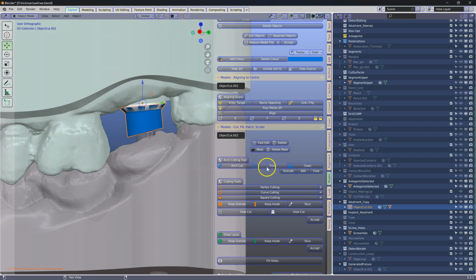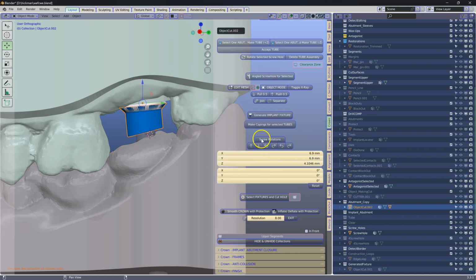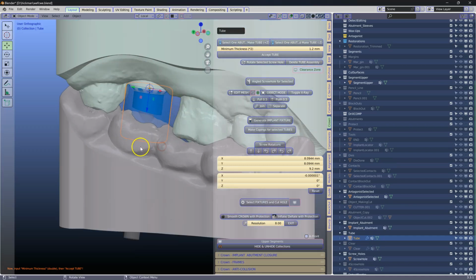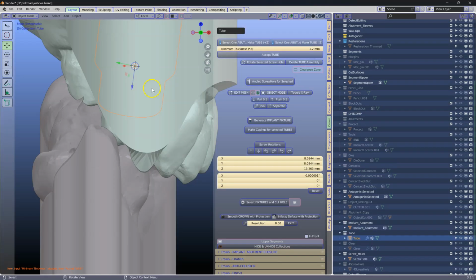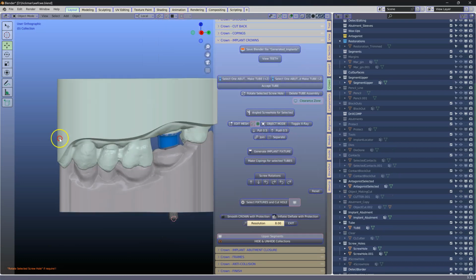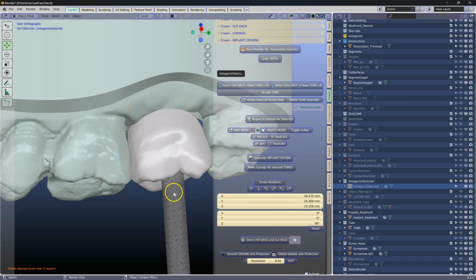Again, what we're going to do is go to the crown module, and make another tube. So here, make a tube. Okay, so it's extracted down in the incorrect way. So we're just going to go Control Z back and hit this button over here. It's always going to go this way around. We cover this well in our tutorials. From here we can grab our crown, and we're going to make our crown now.